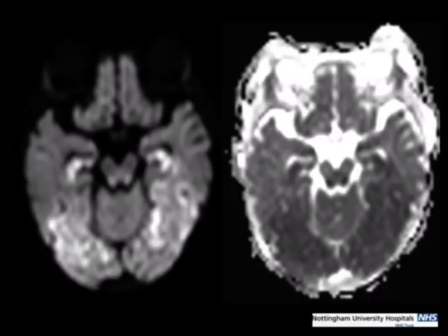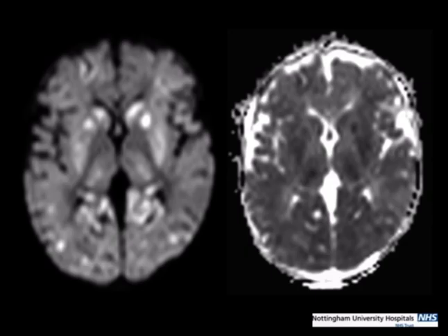Here's some hippocampal diffusion restriction that's not isolated to the hippocampi. This is a 5-month-old who had an unexplained out-of-hospital cardiac arrest. And you can see that, yes, there is hippocampal diffusion restriction, but already, particularly on the ADC map, you're seeing this more diffuse parenchymal diffusion restriction posteriorly. There are spotty areas in the basal ganglia, and also, with the eye of faith, a watershed distribution in the superior convexities, which brings me on to talking a little bit about technique.